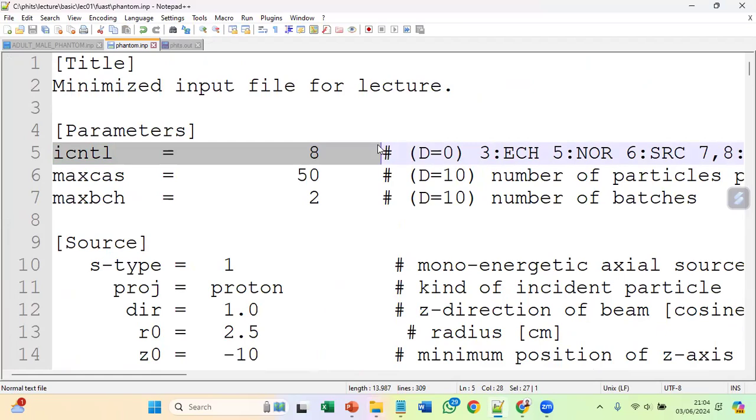Right, sir. What's the question? I forgot. Back a little bit, sir. Remove this interface to the input file for the lecture. This input file, sir.